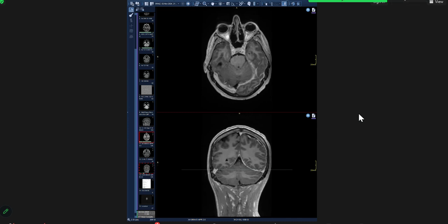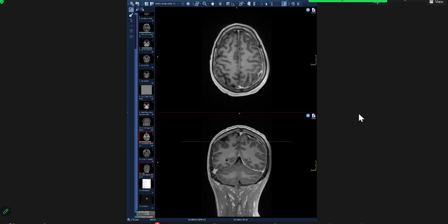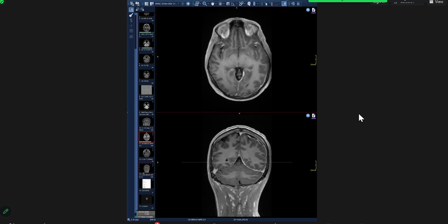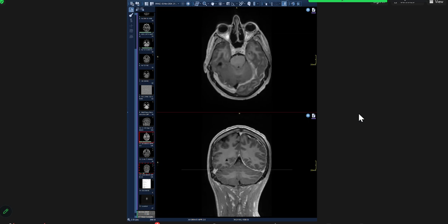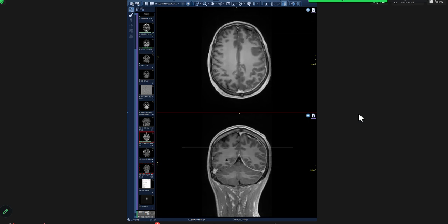Okay, so what are you thinking? I just need your diagnosis, your differential, and what you want. The patient is very sick. Again, an ICU patient, basically. Is there any history of any malignancy? So what are the possible causes of this?